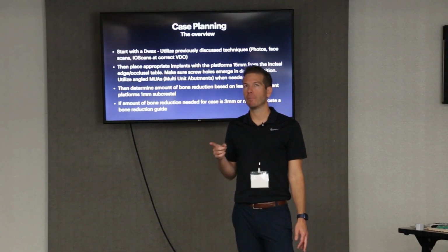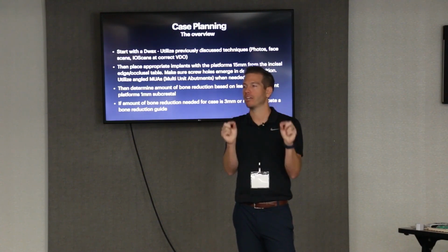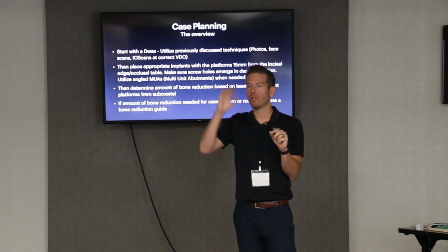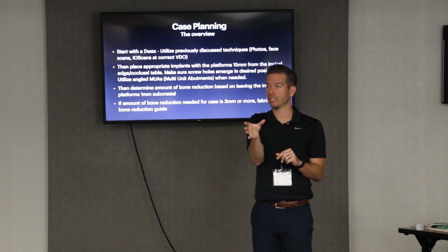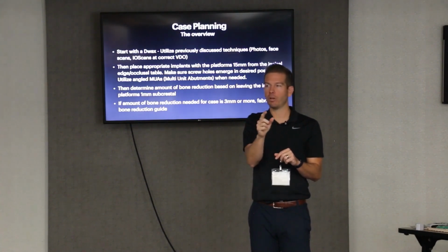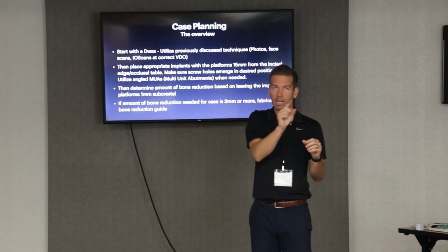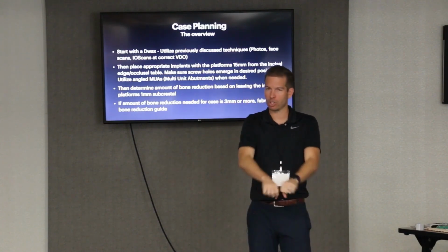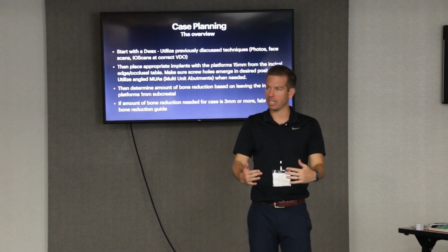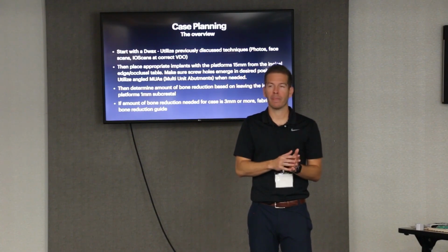And then, so the big thing, the big difference between starting in the denture module and the crown and bridge module is the denture module gives you that tooth chain function. So if you go to the crown and bridge module and you go add tooth, you could select a whole arch and you can drag a whole arch in there just like you can with the denture module. But now when you go to move the teeth, they're all unlinked. Like, you start moving a tooth and nothing is connected. You got to go move every single tooth individually, instead of taking a chain of teeth and just kind of stringing it over the arch and bending that string, you're changing the curve, and they're all stuck together. So that's the beauty of the denture module.